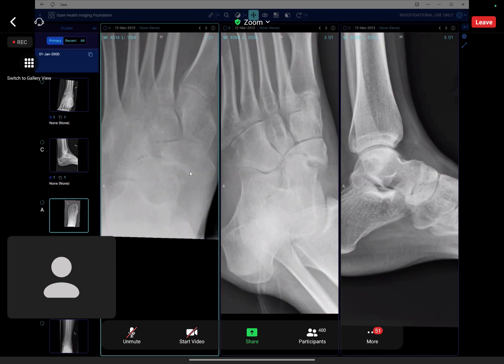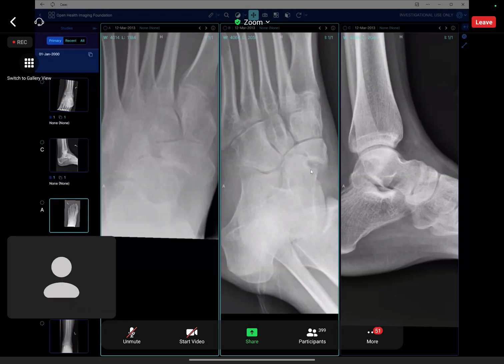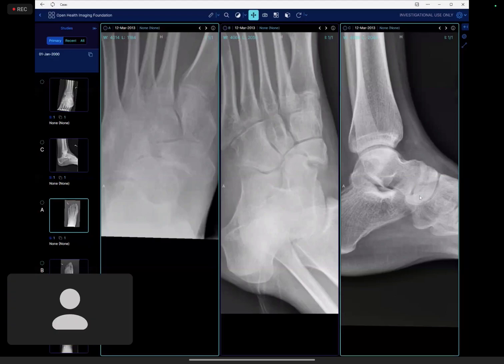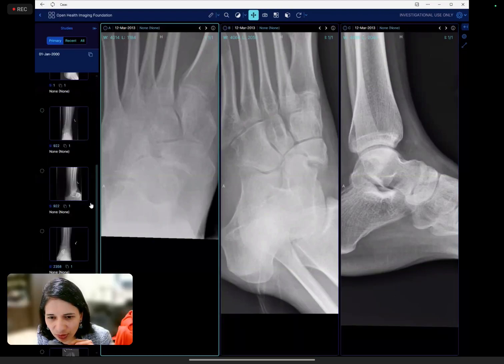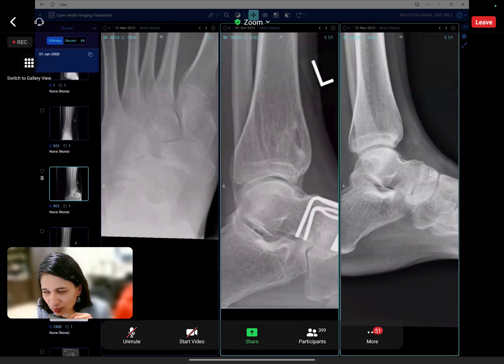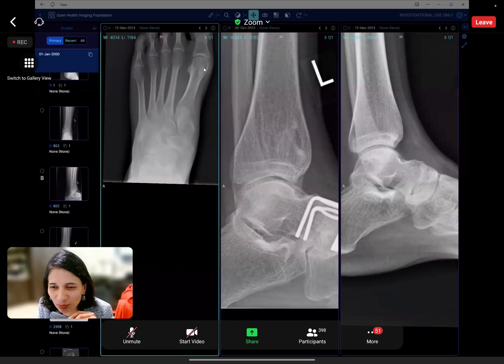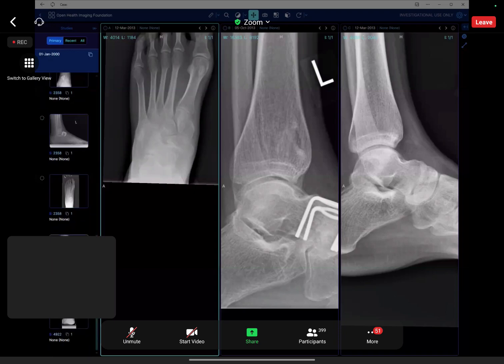So this should be sitting here. Okay. So that's what you're seeing here. Why is this like this? Yeah, wasted, isn't it? And this is what is happening because it's dislocated. It's not in plane at all. I have put it here so that I can show. Then they have gone and fused it because it's been like that for some time. It's painful, and you're right, to a certain extent there's osteopenia because of pain. Okay, so that's what has happened here.